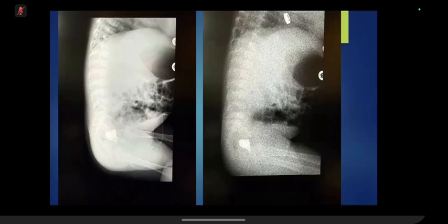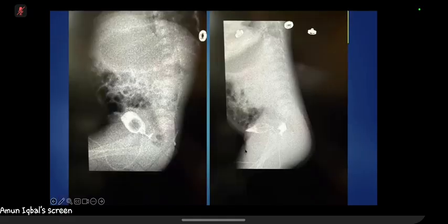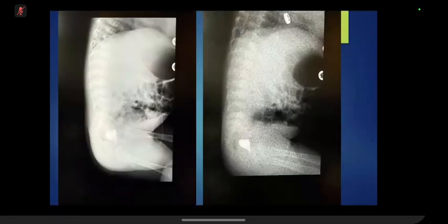Okay. So what is your final diagnosis? So final diagnosis is vesicovaginal fistula with retention of contrast in the urinary bladder. Okay, so you did say this is a vaginal canal, right? Yes, I think this is vaginal. Yes, this shape is same like vaginal canal. Okay, so there is retention of contrast over there. That further strengthens your diagnosis.